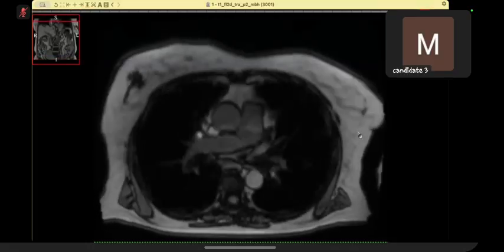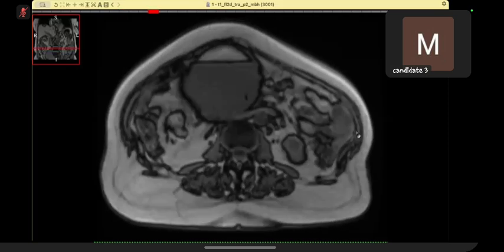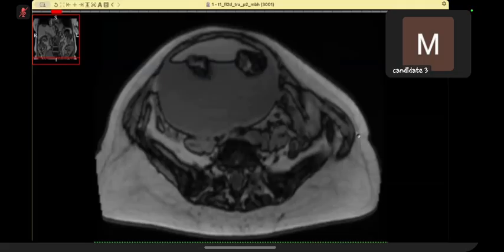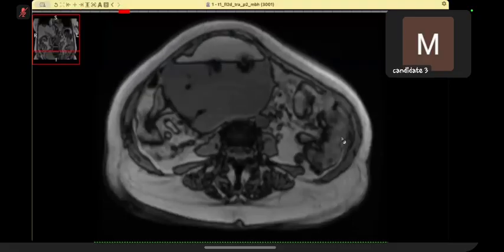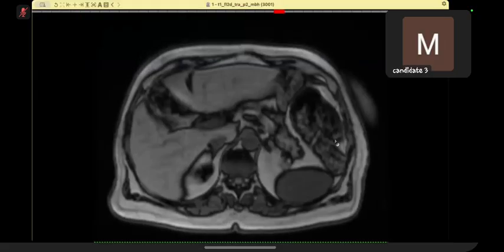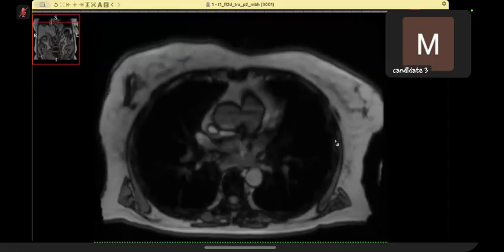Okay, here I can see that the anterior non-dependent altered signal intensity on T2 is bright on T1, which is suggestive of a fatty component in it, and a few signal void rounded areas are also visible, which are more indicative of calcific signal intensities. Okay, the lower part is not included. I think only part of the abdomen is included.